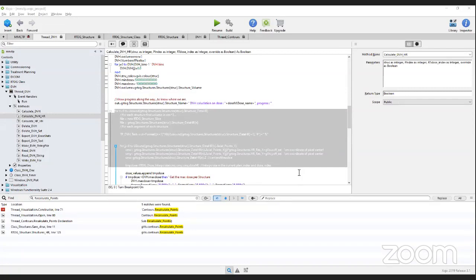My recommendation is to leave it at the resolution of the CT scan, and that's the default resolution. Now, if you're using this calculation for a very large volume, maybe you should consider increasing that to increase the efficiency of the calculation. And then the opposite would be true. If you're using these calculations for very small volumes, it's possible that the CT resolution is not small enough to capture what you're trying to evaluate, and you'll need to decrease that.